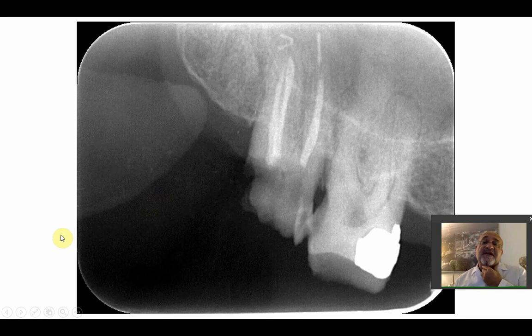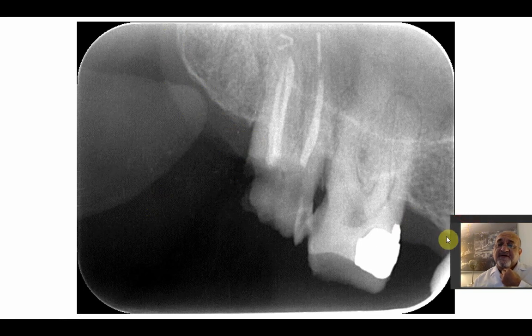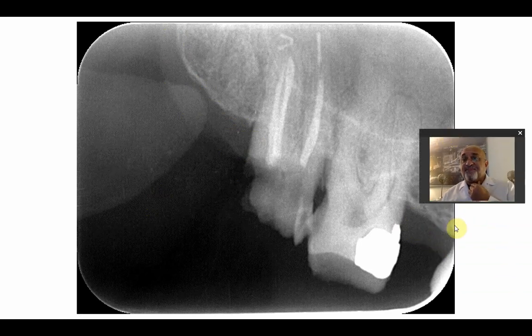See this grayish appearance, which is this area from here. You can see it also here. I'll just move the camera. See, this is actually the soft tissues or the gum, which is overlaying the bone. So this is bone up till here, while this is the gingival tissues. Gingival tissues, though they are soft tissue, are thick.